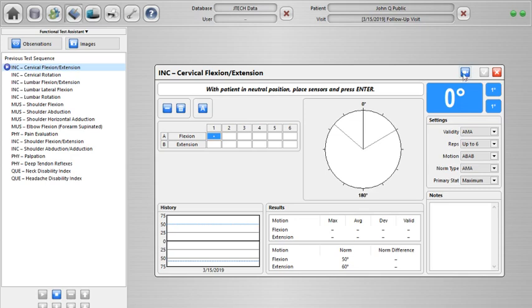We're going to take a look, though, at one big change that we've made in the software, which is with our help icon. When you click on this little video camera, one of the things that we heard from people was that the videos were very helpful for instructing and informing patients about the testing to be done. So we've actually redone all of the videos and audio.